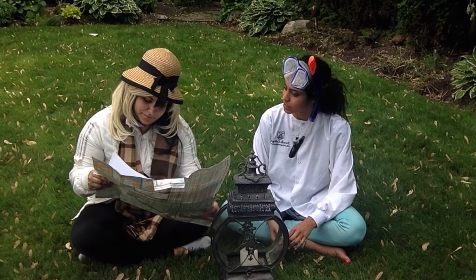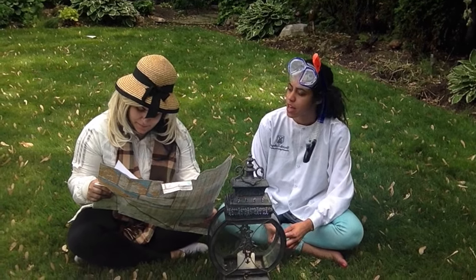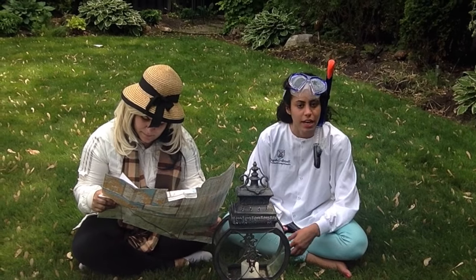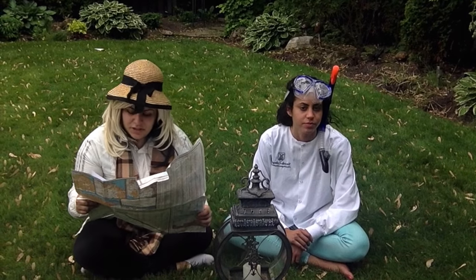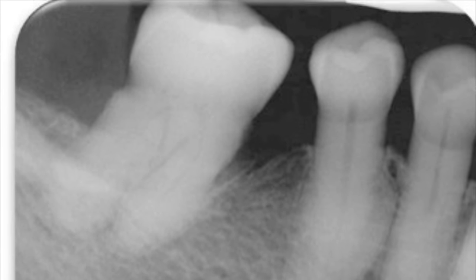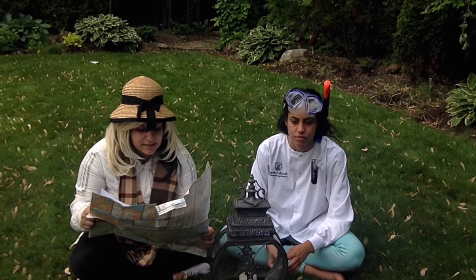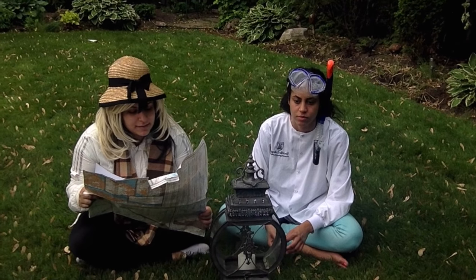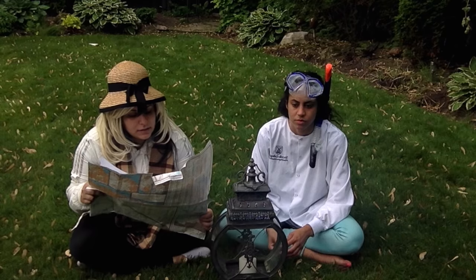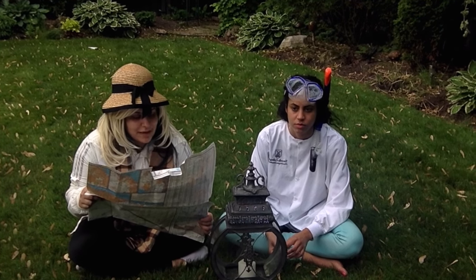As a dentist of the wilderness, I found the periapical radiopacity on your radiograph. These can be seen as white, more dense areas. Some of these conditions include hypercementosis, which is usually a condition described as too much cementum produced on the root surface. It can be caused by inflammation, supraeruption, and some trauma. There are usually no signs and symptoms other than excess cementum on the root. It develops more rapidly than it should.